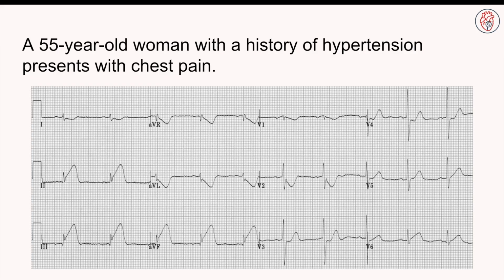All right, you have a 55-year-old woman with a history of hypertension who presents with chest pain. What do you see?